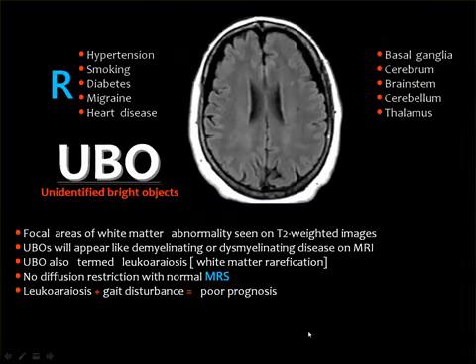Then we came to a major problem in the current days. Many times, many of you, whenever you are interpreting MRI images of the brain, identify a lesion like this one, and the patient is not complaining of anything.